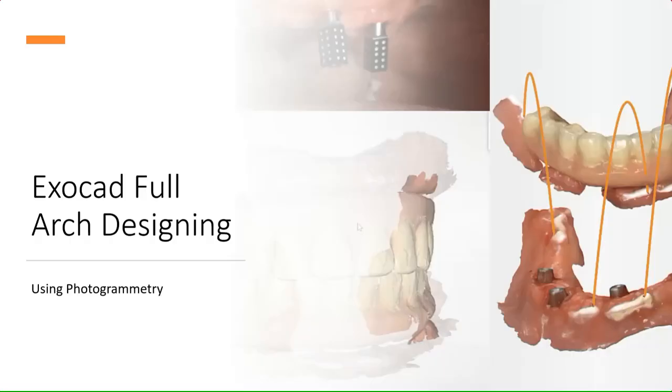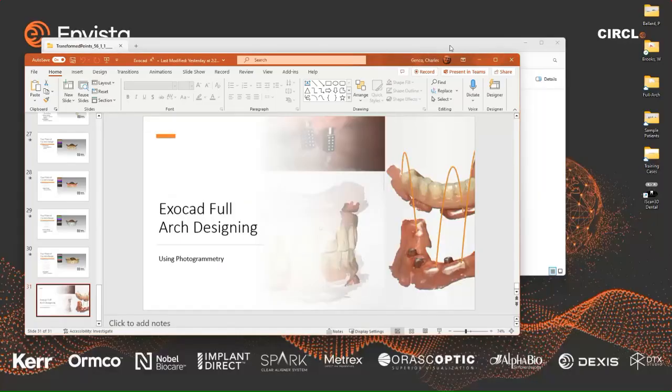Okay, so I'm going to go right into the design software here. I'm going to start though with a little bit on photogrammetry. I'll show you a case that I'll walk through using the photogrammetry data and pulling it into exocad. All right, so let me switch that out.